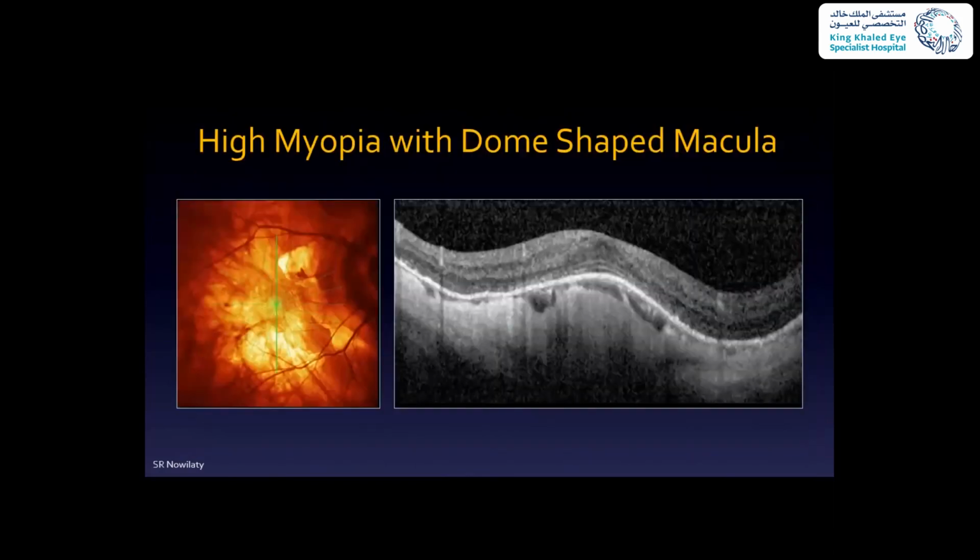And also another choroidal pathology is high myopia, okay? With high myopia, you can sometimes see this dome-shaped elevation. The sclera becomes thick in the posterior pole. It kind of pushes forward towards the vitreous. And this decreases the axial length a little bit, so it's maybe God-given mechanism of decreasing the degree of myopia. But the other signs of myopia are the thinness of the choroid, okay?